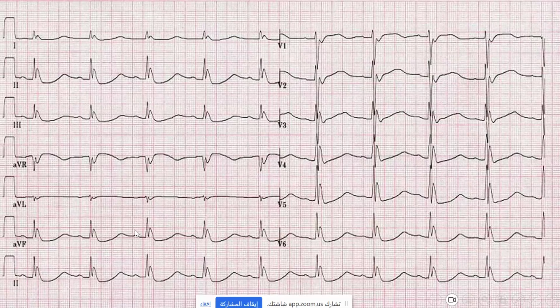Yes, this is a 12 lead ECG, with P wave. I think it is short PR, short. You are right, this is a 12 lead ECG. And if you look at the rhythm strip, you will find there is a P wave and a QRS complex and another T wave. Did you see my arrow? So the PR interval is not short. It's long. Maybe it's a bit prolonged PR interval. Yes, prolonged PR.